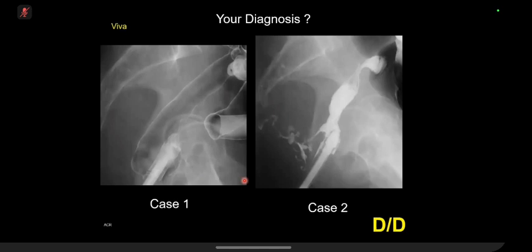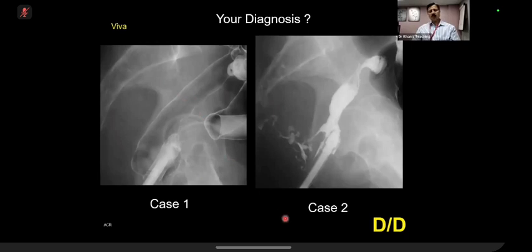That's what I can describe. Okay, so this film, in old days, was quite a favorite film. Now, less likely. Having said that, you have to know everything. Basically, what is happening is that this is the rectum, there is a Foley's inside. This is known as the presacral space.